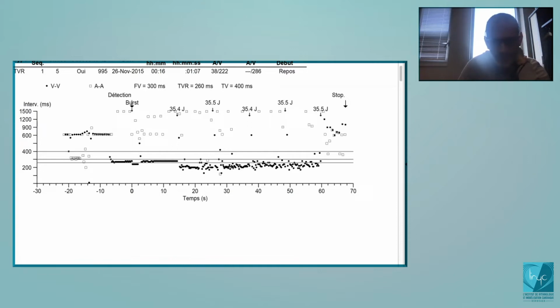Okay, 3 zones have been programmed. One arrhythmia here, one ATP, no effect on the arrhythmia. Then one maximal shock is delivered, and what happens? And then it degenerates into VF. Yep. And it doesn't work until the 5th shock, where there's a restoration of the normal rhythm.